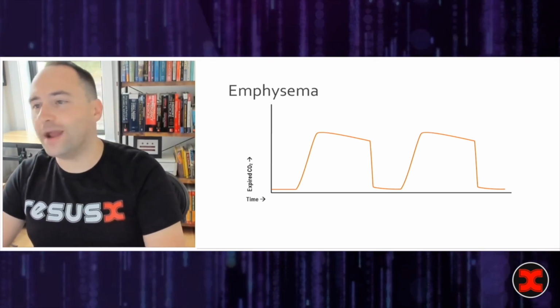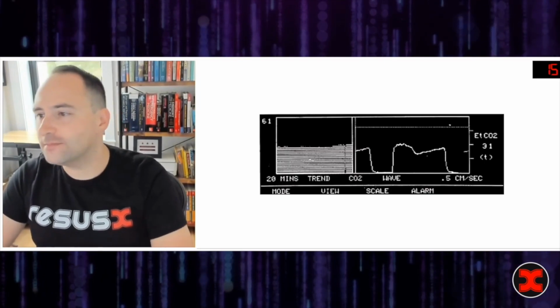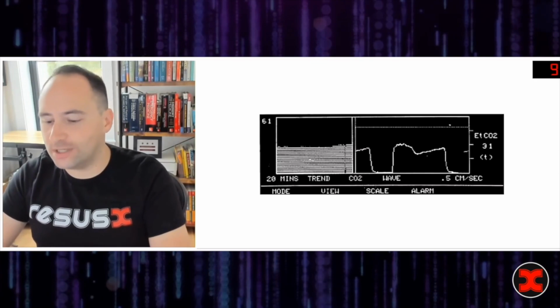All right, next up is my absolute favorite end-tidal tracing. My question to you, what surgery did this patient have?